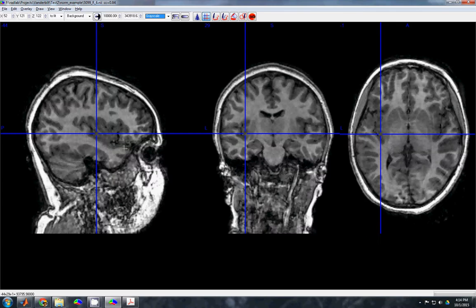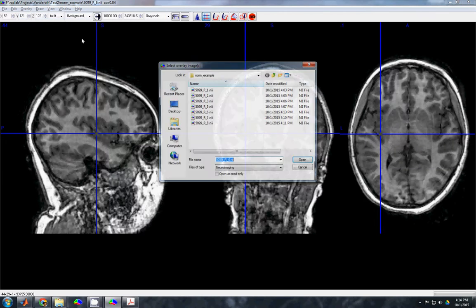If you need extra papers talking about insula anatomy, I'm happy to give that to you. But just to start with, just make your best guess. Try to be bold. Try to cover as much of the insula as you can, so you don't have overlap, but you don't have a bunch of gray matter spaces between regions also. If you can come up with something that looks kind of like this, right?